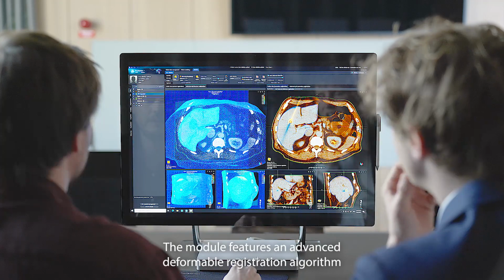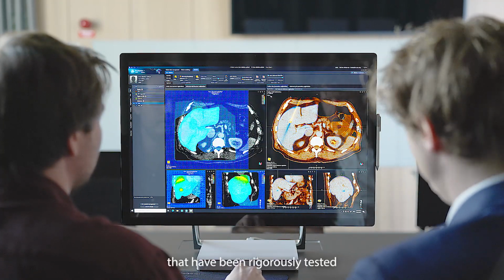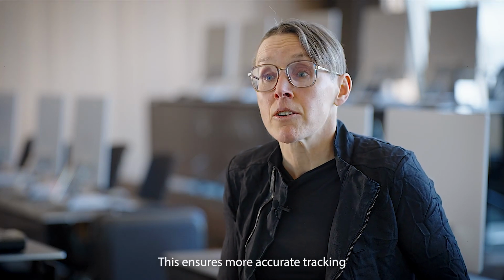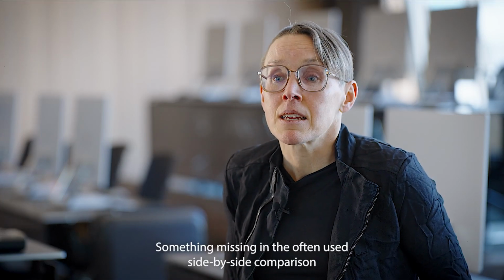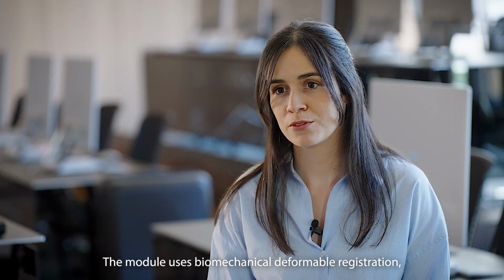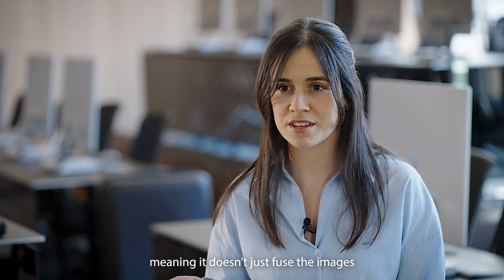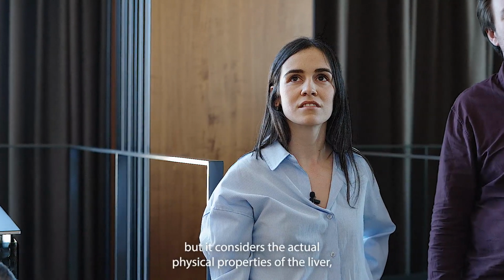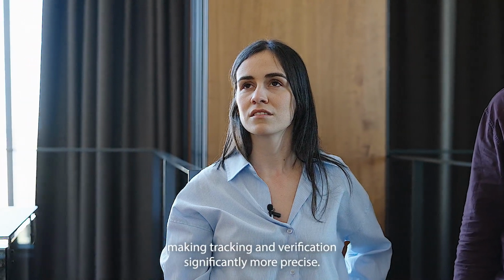The module features an advanced deformable registration algorithm that has been rigorously tested and used in clinical radiotherapy workflows. This ensures more accurate tracking of the movement of the liver along with the position of the tumor, something missing in the often used side-by-side comparison of images by eye. The module uses biomechanical deformable registration, meaning it doesn't just fuse the images by aligning them like it's done with rigid registration, but it considers the actual physical properties of the liver, making tracking and verification significantly more precise.